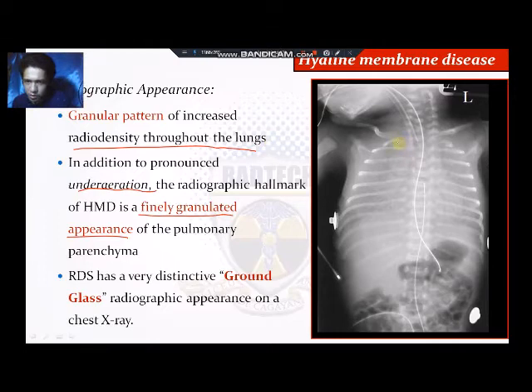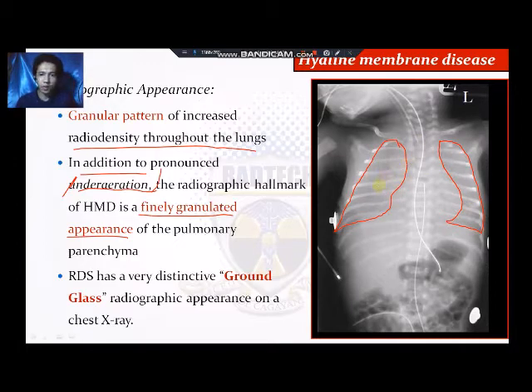Yes, so diba supposedly aton ta makita nga black ang lungs ni patient. Aton ta makita nga black ni siya diri dapit nga portion. Then because of the disease and because of the under aeration siya, so munang medyo puti na din ang appearance sa lungs sa atong patient. So later on then wala na hangin nga makasulod gyud diri, so munang mag-collapse na din ang lungs ni patient. Mugamay na din, puti na din kanang surrounding dayon.